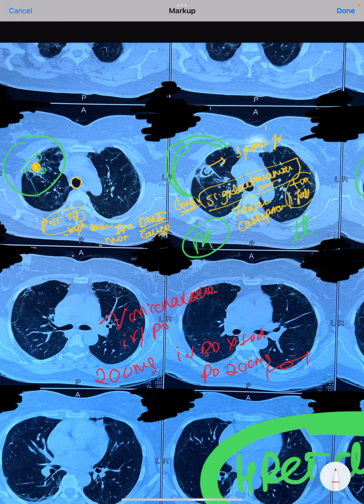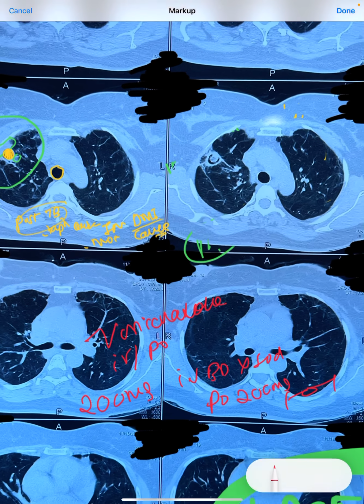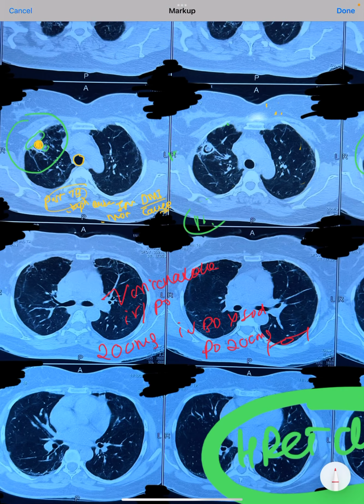So this is very, very typical of a fibrocavitary lesion, highly suggestive of aspergilloma, which can be investigated or diagnosed on the basis of sputum or bronchoscopic aspergillus test examination, serum galactomannan, typical symptoms, and treatment with voriconazole, which is an excellent drug for this. And most of the time, voriconazole treats all these patients.